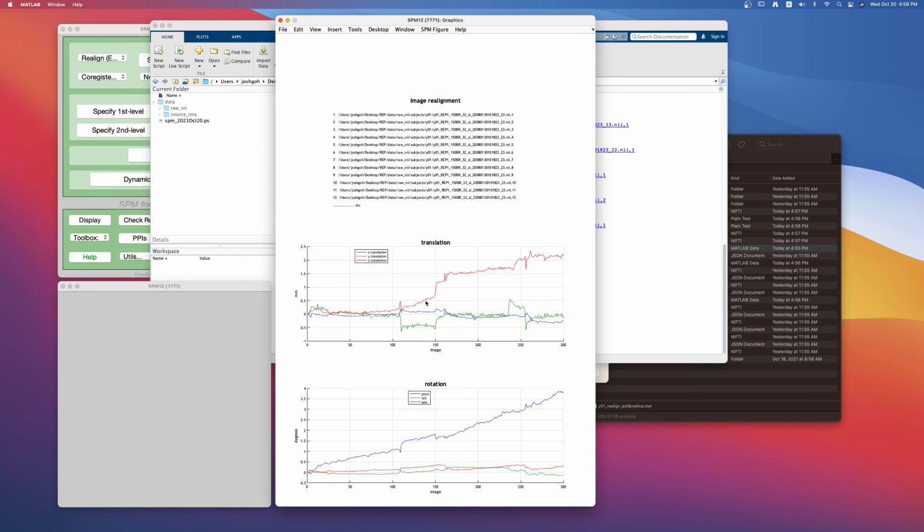This is normal because remember, this is run 1, rep 1, and this is rep 2. So in between runs, it's kind of expected that there will be a big jump between the first volumes of the 2 sessions or the 2 runs. That's what the inter-session alignment does, right? It first corrects the first volumes of all the other sessions to the first volume of the first run, as we have said. And then it will do the intra-session alignment, which is then all these fuzzy lines, it will bring it to the space of the first volume. And then correspondingly for the rep 2 as well, all right?